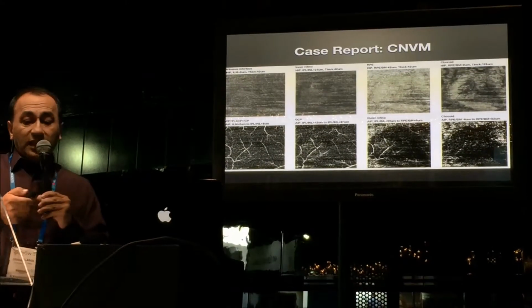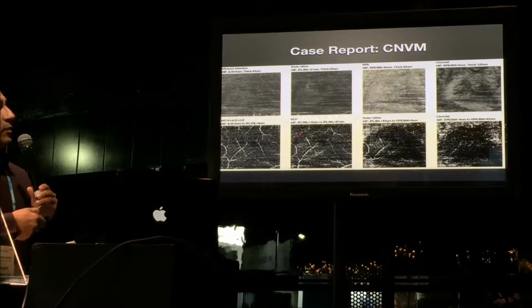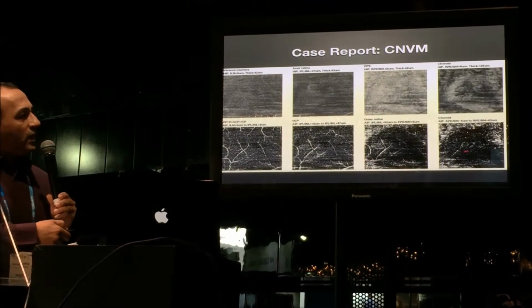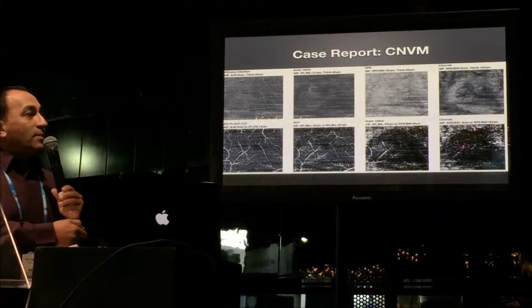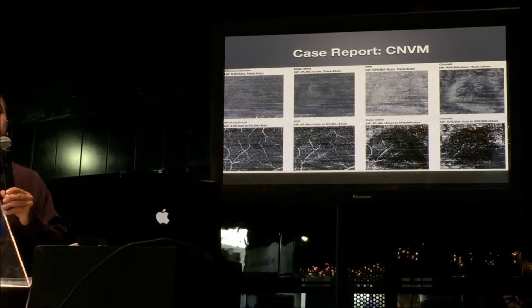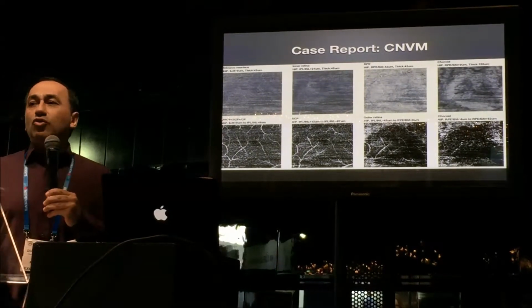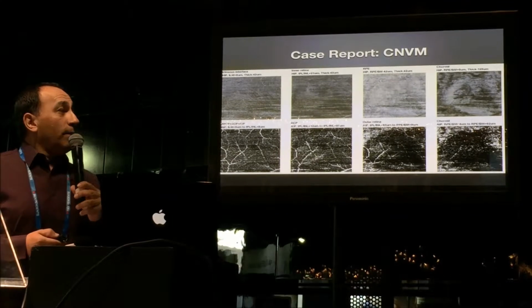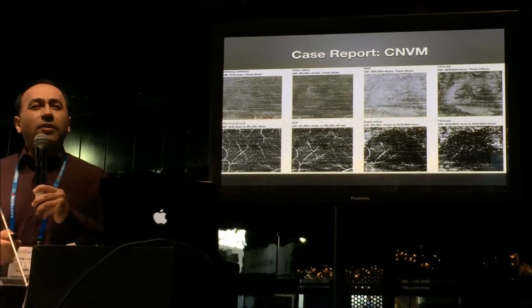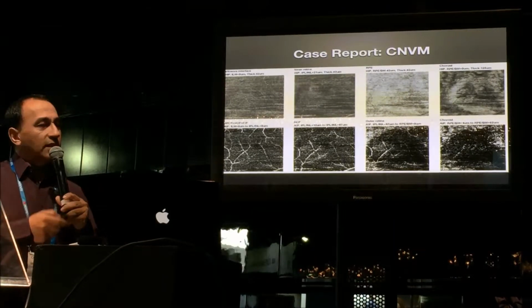When we do an OCT angiography of that area, we're not really interested in the middle retina or inner retina, but when we get down to the choroidal level, we're really seeing an absence of blood vessels there. So even though that's a neovascular membrane, it looks like it's quiet or dormant or scar tissue. And I'm very confident in monitoring that patient rather than referring them for further anti-VEGF injections.